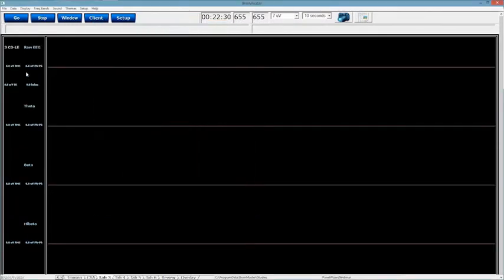You can turn on all these features, and as you can see, for every single waveband now I have a zero line. I'm also looking at my peak to peak and RMS microvoltage. And right here on my raw EEG, I'm looking at the millivolts of the DC offsets, and I'm looking at my K-ohm reading or impedance readings on here. So I've been able to customize this panel basically to meet my needs on that.